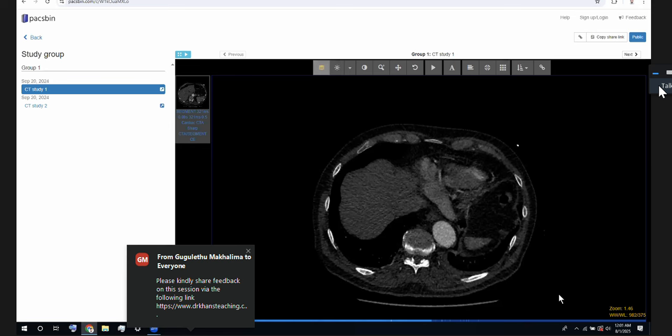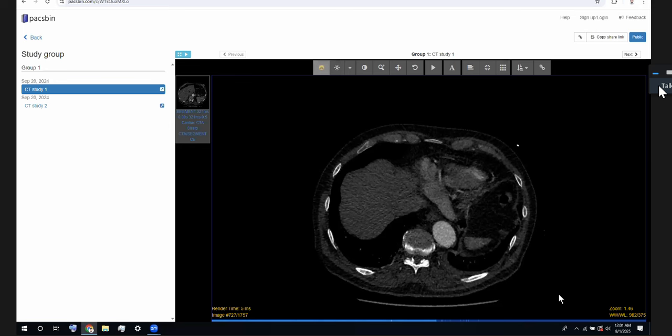This is actually quite a common scenario: the patient comes in with chest pain, they think it's PE, and they get a CTPA, and then there's no PE. It's always really important to look at the thoracic aorta because medialization of the intimal calcification is quite a sensitive sign for something going on in the aorta, so you'll see this kind of thing often. Good. Let's look at some more cases.